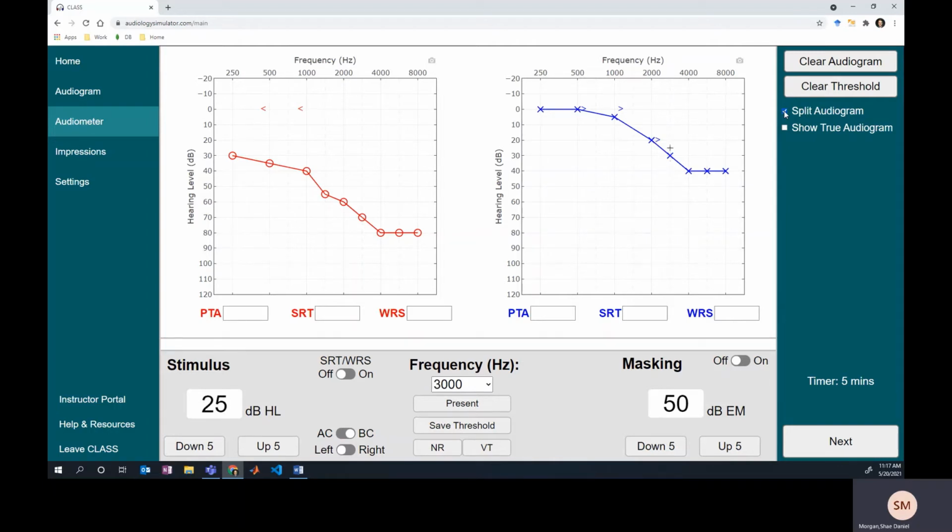So some people will use an up pointing arrow. Some people will use the left and right arrows to indicate that the threshold should be the same. And so there's some debate about how that should work. If you've got feelings about it, I'd love to hear your thoughts in the comments down below.